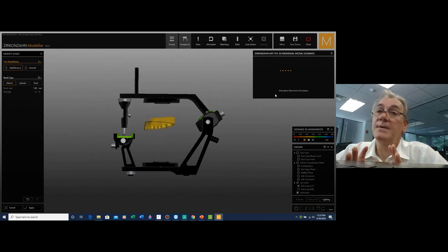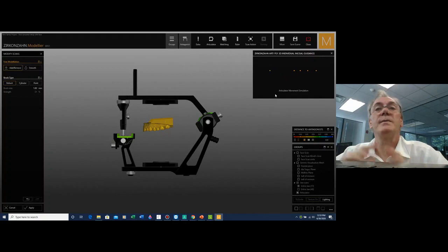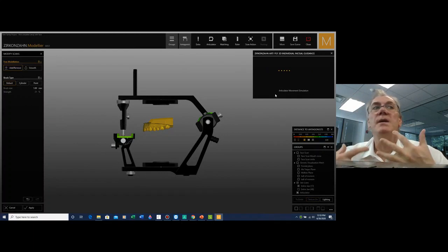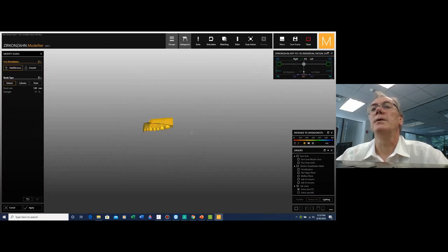Now, these are sometimes functions that we do in prosthetics as well, not only on natural dentition. This is where it starts, performing the functional evaluations on natural dentitions, but certainly it's more or less the same idea and the same techniques when we are working through prosthetics. I think that maybe we will also have the opportunity to do a video in relation to some setup cases, so we will actually see them in function through the actual setups, how we move the teeth and how we relate to the angles in coordination to the movements that we need to perform. Here we go.